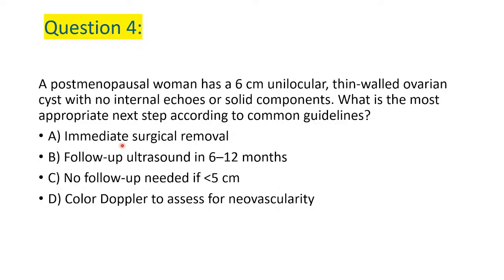A. Immediate surgical removal. B. Follow-up ultrasound in 6 to 12 months. C. No follow-up is needed if less than 5 centimeters. D. Color Doppler to assess for neovascularity. So which is the most likely response?